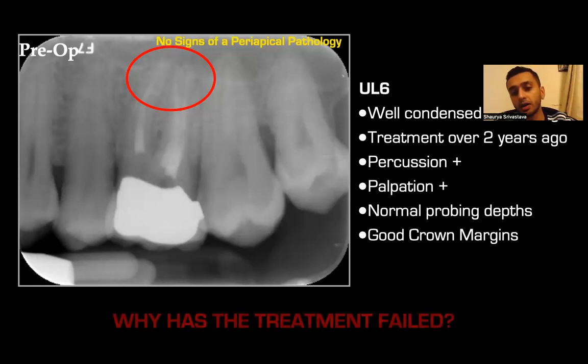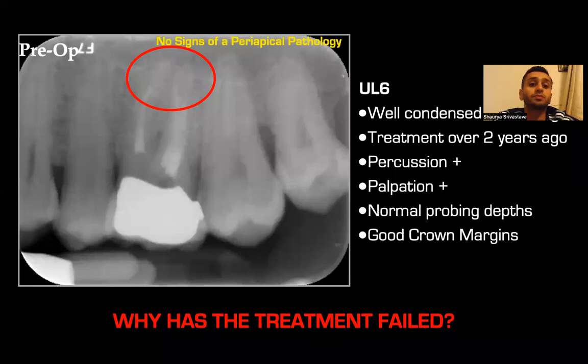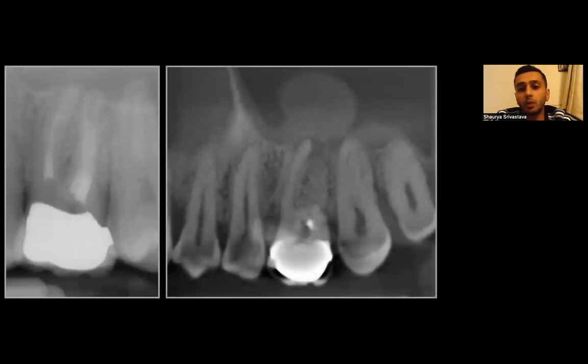So we have an inconclusive diagnosis over here. We do know that these teeth are notorious for having an MB2. The CT study tells us that it's about 96% or 97%, based on which country or population you look at. A CBCT study tells us that it's prevalent between 91 to 93%. So it could be one of those. When we look over here, you see there's a lesion present here. There's no lesion present over here.